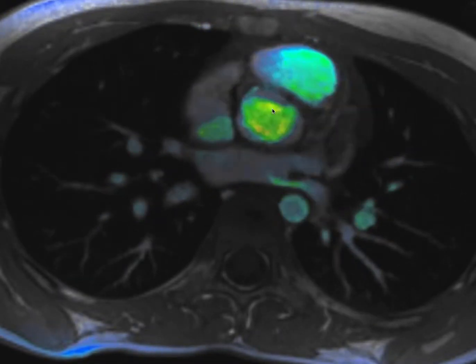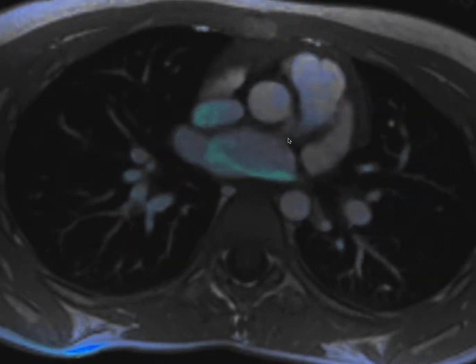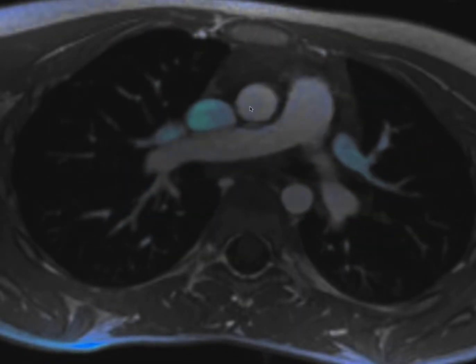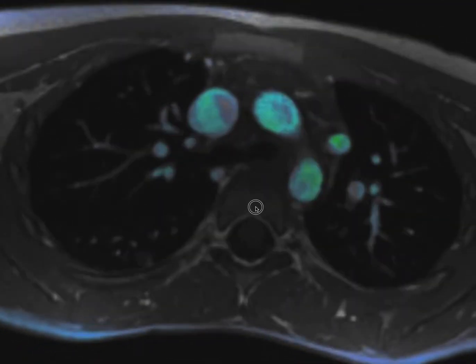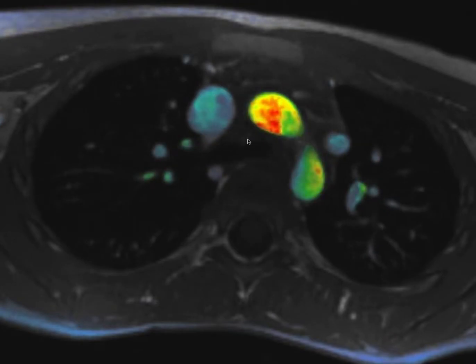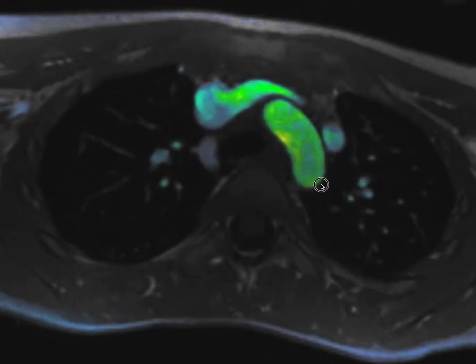A couple of the arteries that come off right away are the coronary arteries. It's very hard to see, but there's one coronary coming off here. And then you have the ascending aorta. This ascending aorta comes superior. I'll just show you right here. Here's the trachea. It's hard to see, but this is the trachea. The aorta is on the left side of the trachea as it forms the aortic arch.